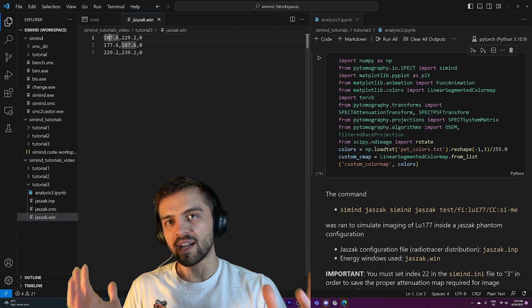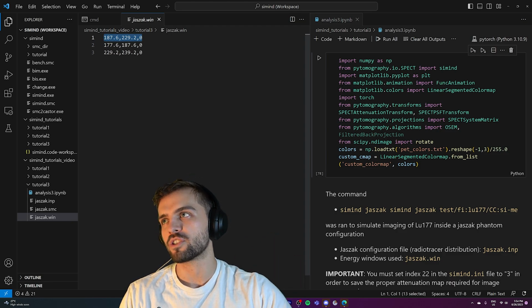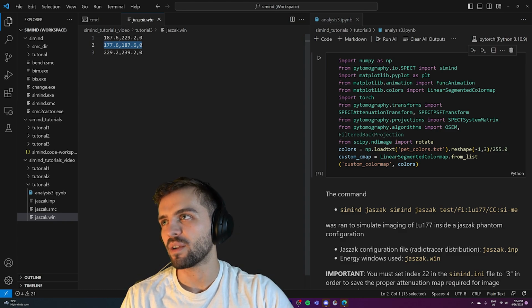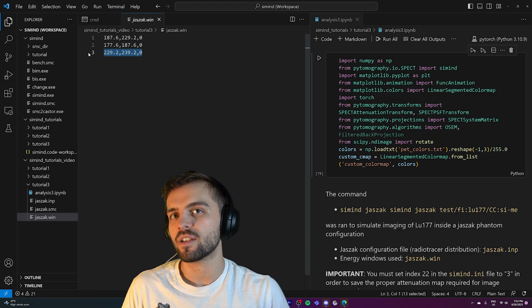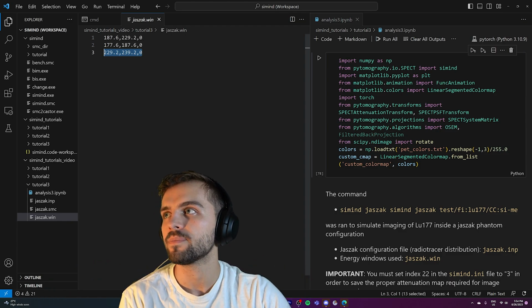Remember that there's finite energy resolution, and we want to get as many photons as possible. So we have a window that stretches pretty far on each side from 208 keV. Now we also have a window that has less energy than the emission peak and a window that has more energy. And we'll get into why we're tracking that in a second. Remember, we can choose any energy windows we want because we have access to the full spectrum in the list mode data. We have that in real life as well.